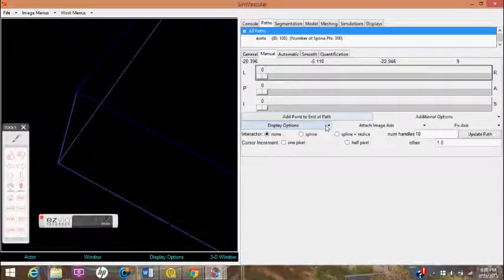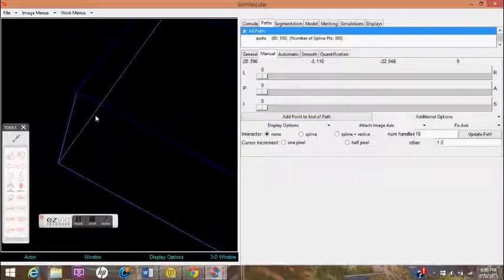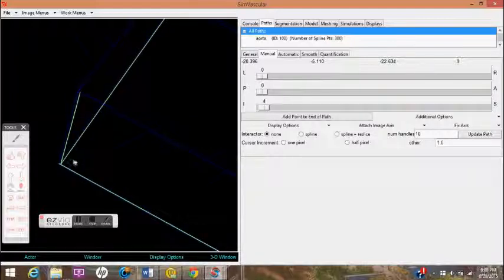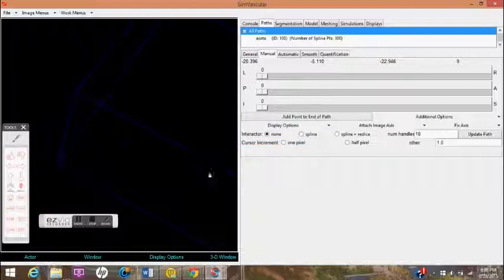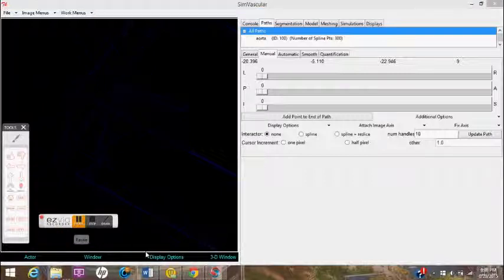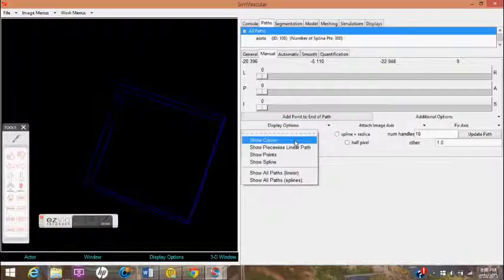If you click on it, you can play around with it here. There it goes. It lights up green when you click on it, and that'll change the values of the cursor where it's at. And now the other options, I'm just going to show you there.